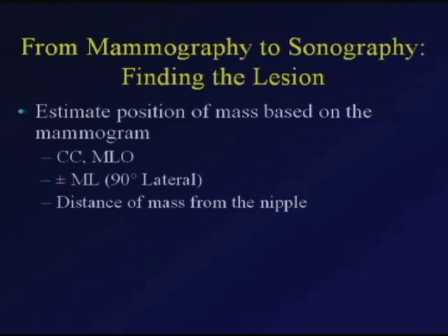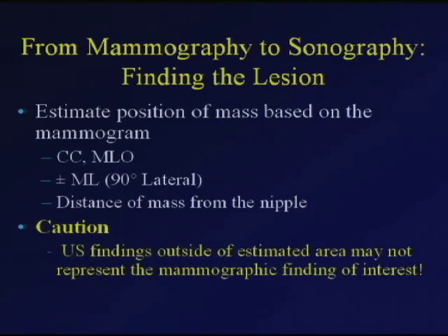When we're going from mammography to sonography, we have to find the mass. And we estimate the position of the mass based on the mammogram. And we can use the CC and the MLO view to do that, but it's also very helpful to have a 90-degree lateral view and to understand the distance of the mass from the nipple on the mammogram as well.